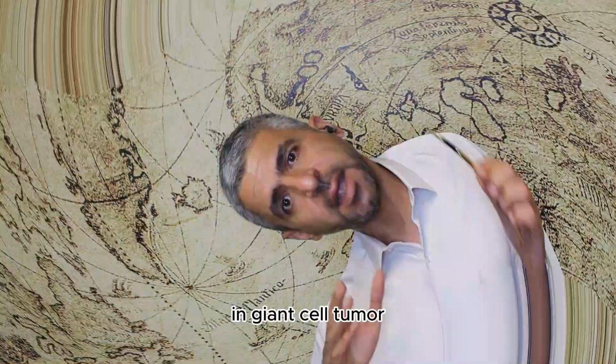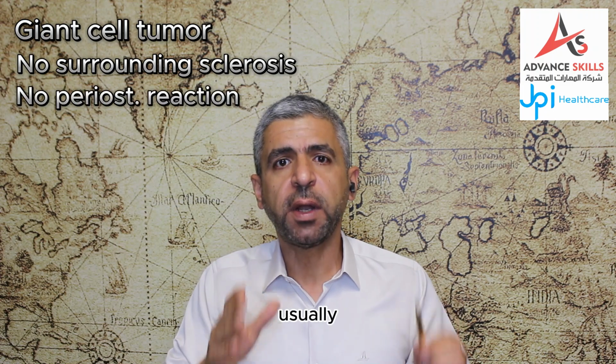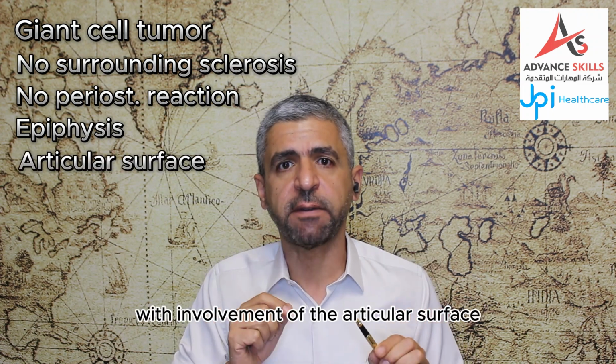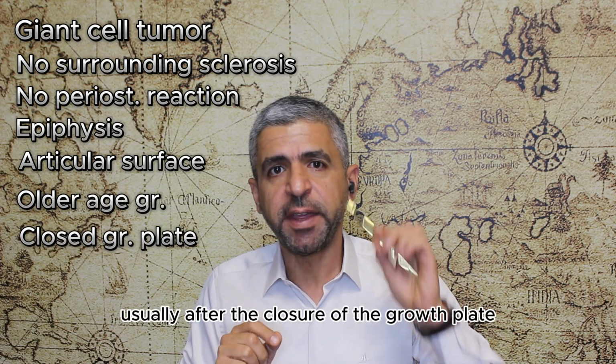In giant cell tumor, there will be no surrounding sclerosis or periosteal reaction. Also, usually it involves the epiphysis rather than the metaphysis with involvement of the articular surface, and it's seen in older age group, usually after the closure of the growth plate.